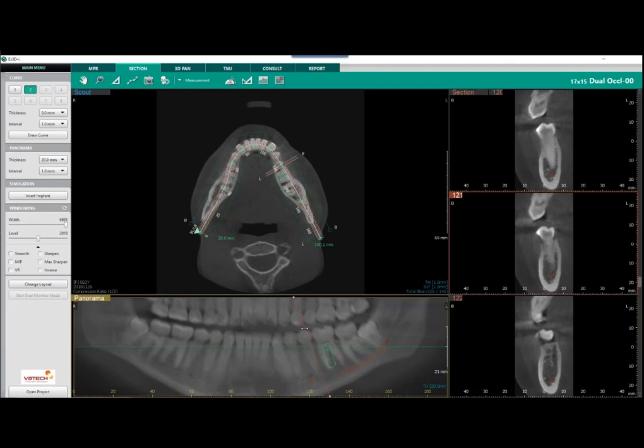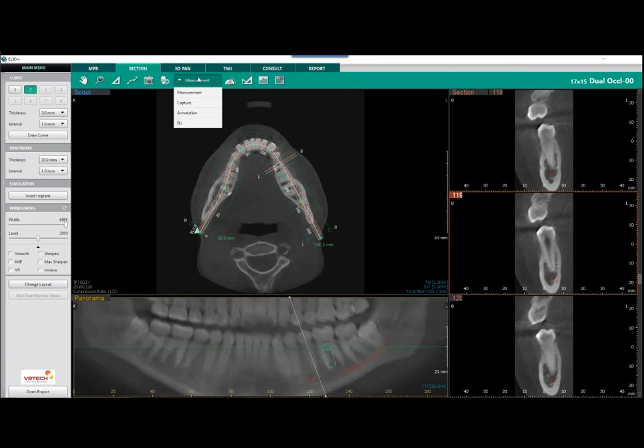I think now might be a good time to look at some additional measurement tools. We have not covered those measurement tools. If I do my drop down, we've looked at our measurement over here. We're going to go over here to my angle tool, and if I hover over that, it tells us that's our angle tool. I can left click, drag, left click, drag. It puts an angle tool on there.